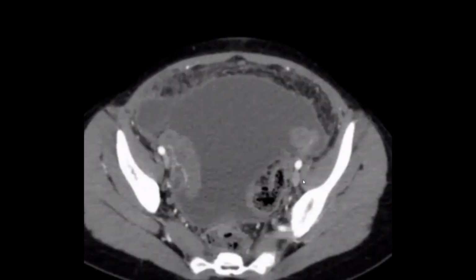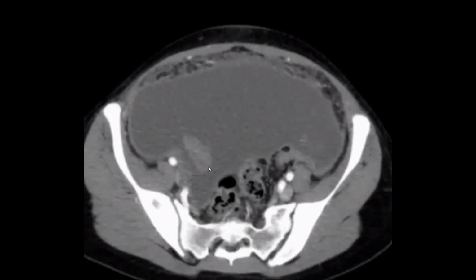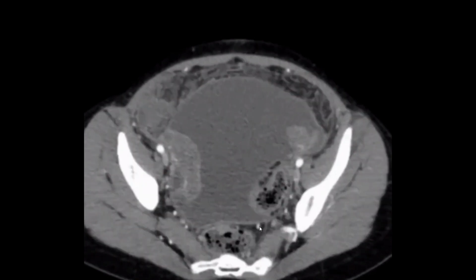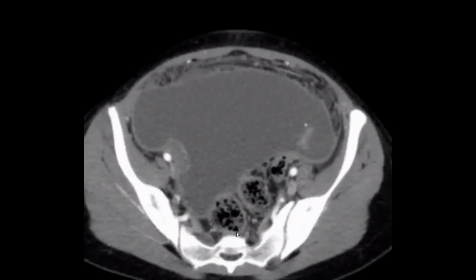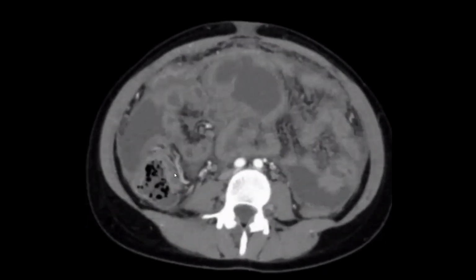What's your opinion? You got all the abnormalities now. We have omental infiltrates, peritoneal thickening, peritoneal collections, and bilateral adnexal masses. Can you show me the adnexal masses again? Sir, if the patient is a young female with a history of fever and abdominal pain, my top differential would be abdominal tuberculosis, which is complicated by ovarian abscess. Other differentials would be some neoplastic etiology.